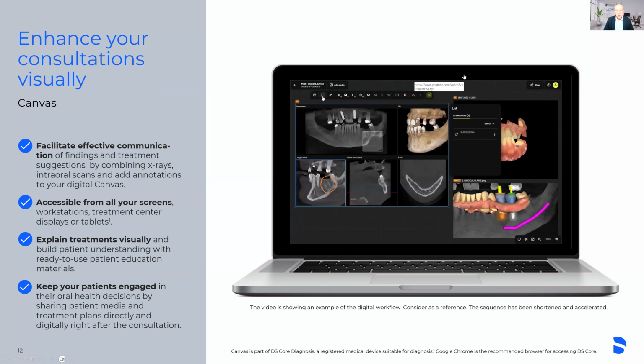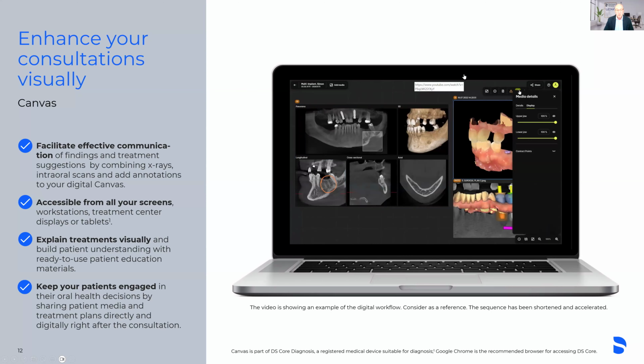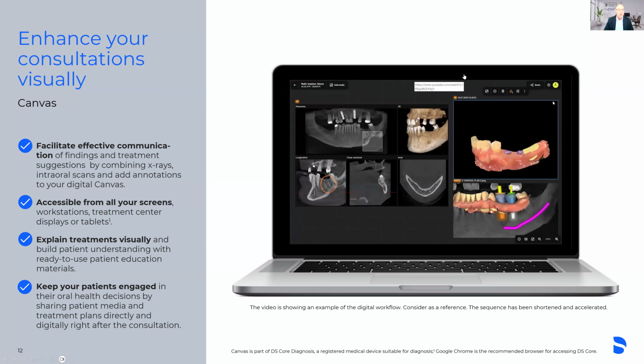It also makes it very easy for your office manager to follow up on treatment. So maybe there's some treatment you're going to follow up on, or you haven't heard from a patient accept treatment. It's really easy to reshare everything all from one screen in Patient Canvas and have that follow up.